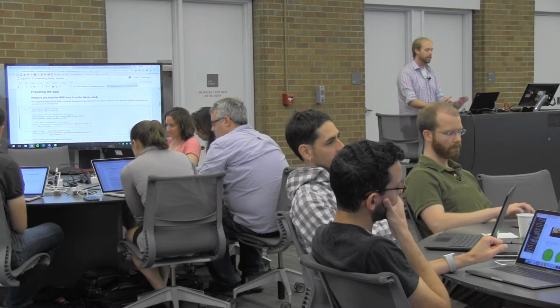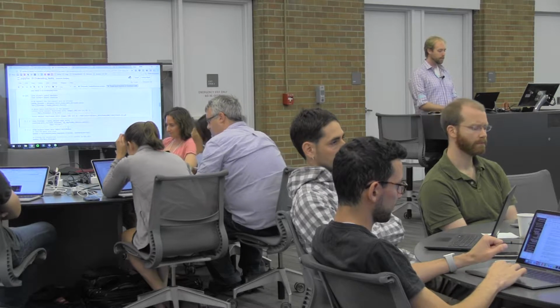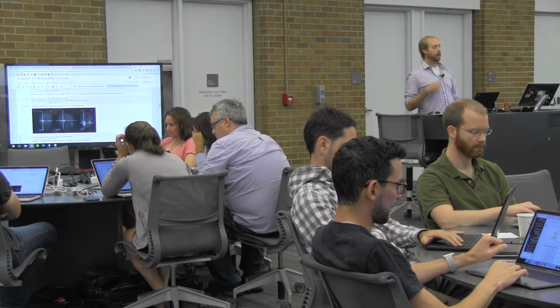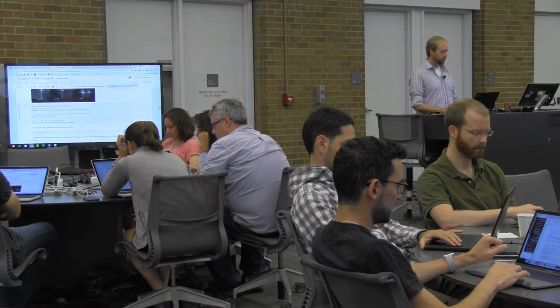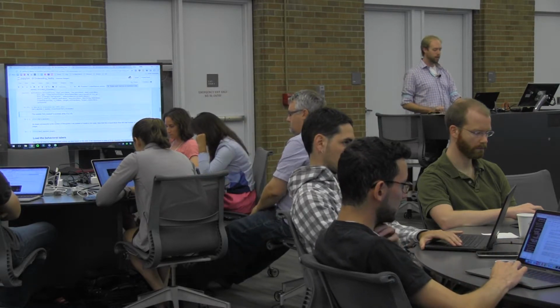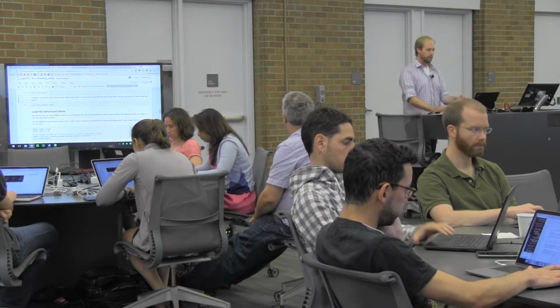Okay, so in this data set, though, we're going to be doing decoding. We're going to start off the same way as we just did before by loading the Haxby data set as well as the mask itself. So again, here's the mask that we're going to be using. We'll use this subset of voxels to try and decode the category of object that the person was looking at. We're going to feed it into this Nifti Masker, same way as we did before, and then transform the volumetric data, same as we did in the previous notebook. So now we have an output here that is of shape n samples by n features.